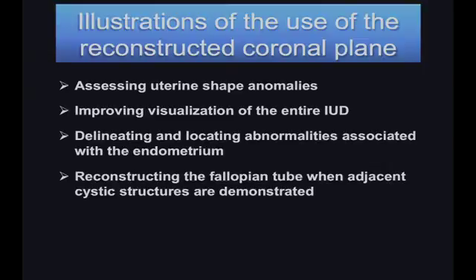So I'd like to show examples that illustrate practical applications of 3D sonography of the pelvis. This will include assessing uterine shape anomalies, improving visualization of the entire IUD, delineating and locating abnormalities associated with the endometrium, and reconstructing the fallopian tube when adjacent cystic structures are demonstrated.